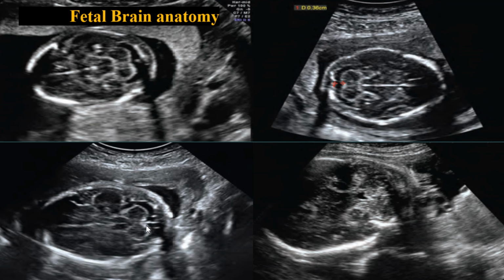And now here we can see the cisterna magna septa, and this axial image of the head depicts a normal linear septa in the cisterna magna extending from the midline and from the junction between the vermis and the cerebellar hemispheres on each side posteriorly to the occipital bone. And here we can see the oblique image of the fetal head, and it shows here the fourth ventricle in the anterior portion of the posterior fossa.